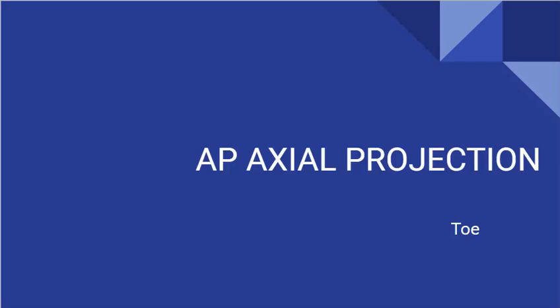Welcome to the image analysis for toes. We will be reviewing guidelines for common projections of the AP axial, the medial or internal oblique, and the lateral toe projection. We will also be reviewing common positioning errors and corrective actions.